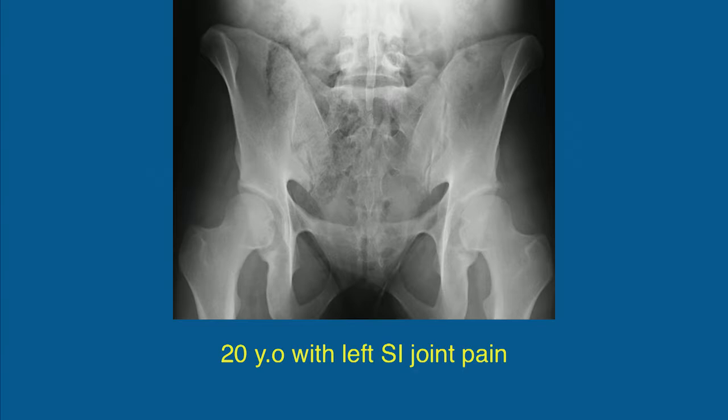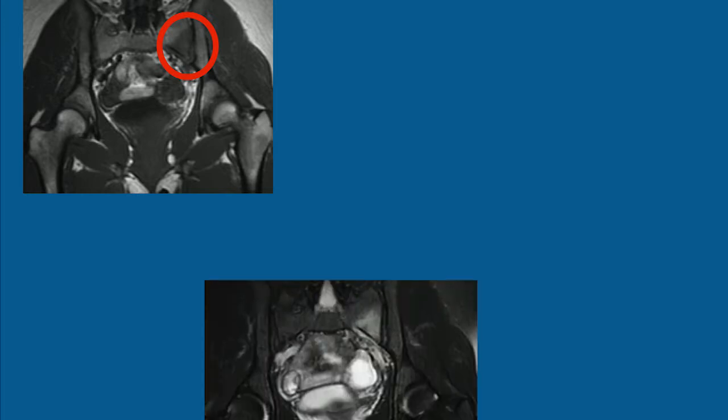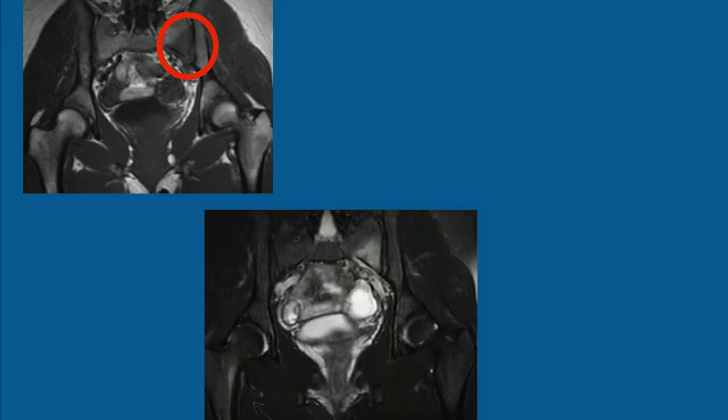Here's another young individual who presented with SI joint pain. One of the things that we might think about in a young individual with SI joint pain is obviously a spondyloarthropathy. So looking at these SI joints, they look totally normal. So we recommended the patient go on to have an MRI. And you can see that triangular area of low signal in the left hemisacrum. Let's look at the cheater sequence, and the cheater sequence, in fact, also shows us the fracture line a little bit easier.